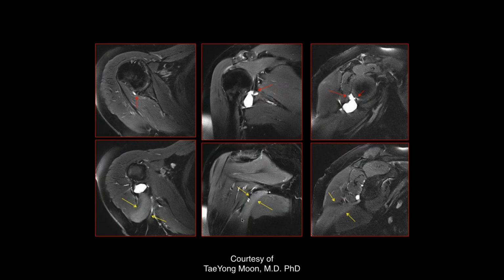Which muscle is this? So you're probably talking about teres major and latissimus dorsi. In this patient, often they're both involved. This is probably more the latissimus dorsi. So when you see large paralabral cysts, especially in areas where you know they might involve the nerves, it's important to take a second look at the muscles that may be involved.